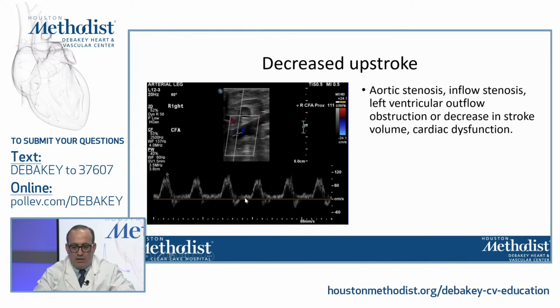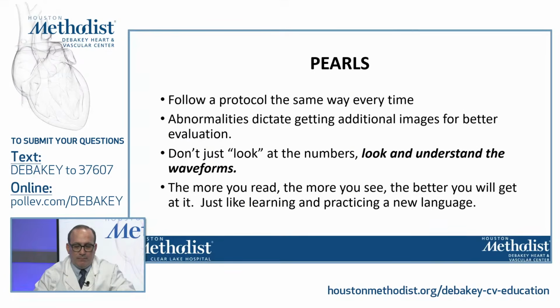This patient has decreased upstroke, rounded systolic peaks, low resistance appearing waveforms. This could be aortic stenosis or cardiac pump failure.